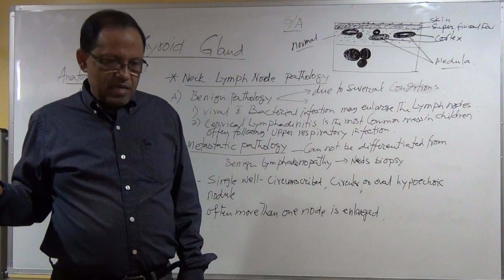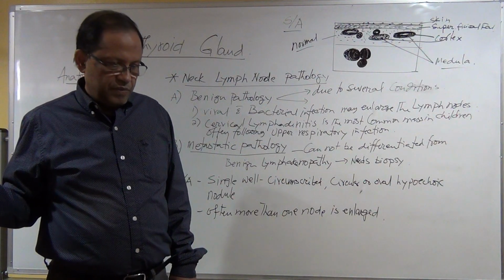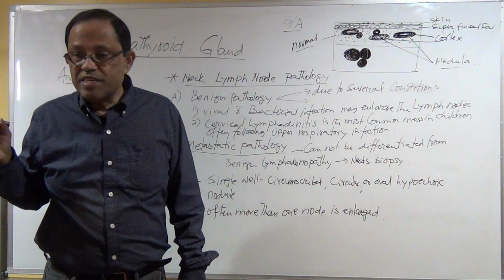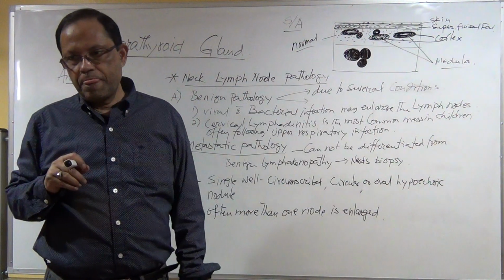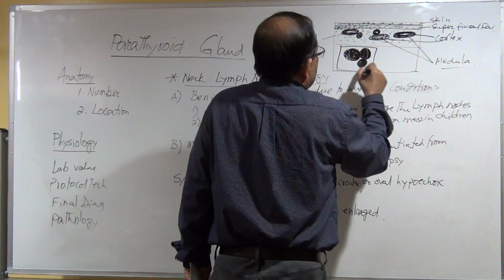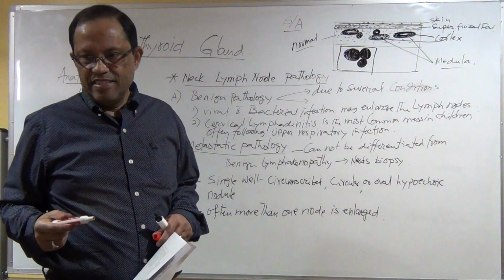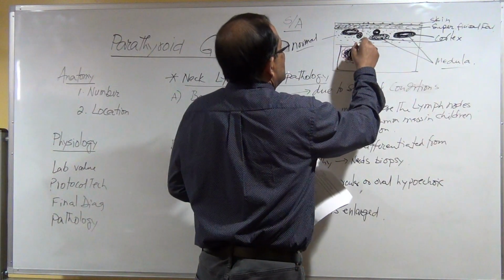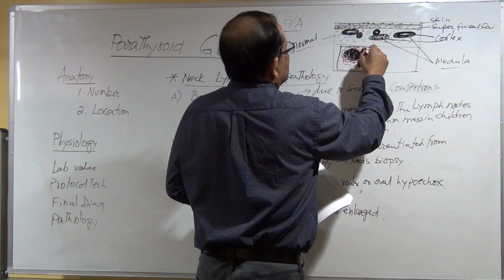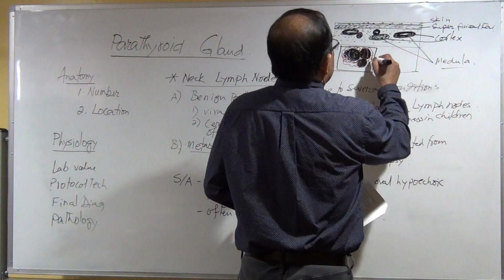In the lymphoma, the Burkitt's lymphoma, and there's another one, Hodgkin's disease, the lymph nodes are isolated, multiple but isolated. But in tuberculosis, they are matted together. And you will see like that, lymph nodes are enlarged, and you click the color. What are you going to see? If it is inflamed and is metastatic, there will be hypervascularity. Okay, so this is a very important finding, that hypervascularity.